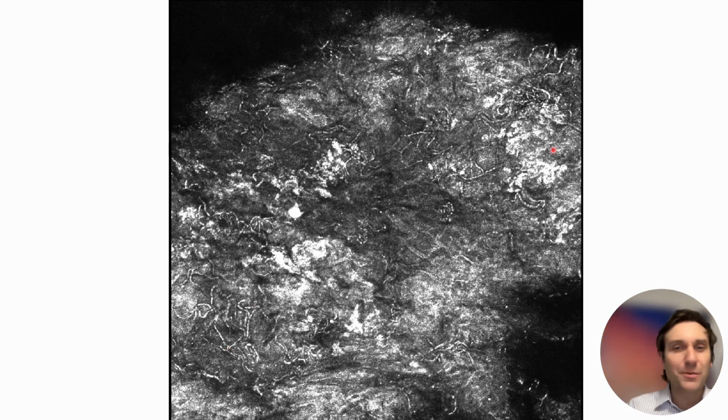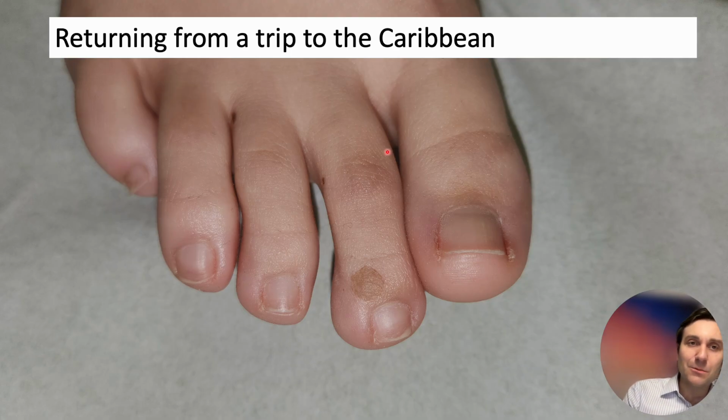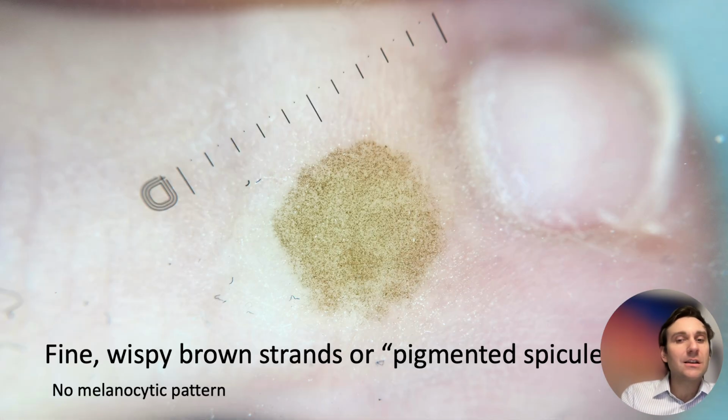So you know confocal microscopy is not good for acral sites, right? Because it's very thick skin and you never get to the dermoepidermal junction. But this is a corneal disease. So if you can see the corneal layer, you will use this confocal for the confirmation of the diagnosis. Another patient went to the Caribbean with this lesion here, same pattern. Fine, wispy brown strands of pigmented spicules with no melanocytic pattern, tinea nigra.